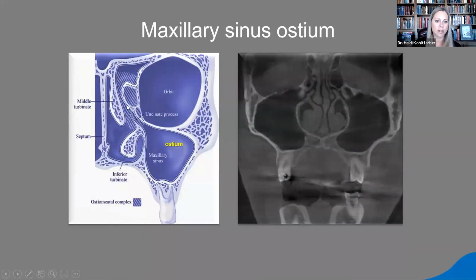And here's our sinus drainage pathway. This is our osteomeatal complex. This is what our ENT is very concerned about. Want to make sure that everything's draining appropriately for the patient. And we've talked about these before.